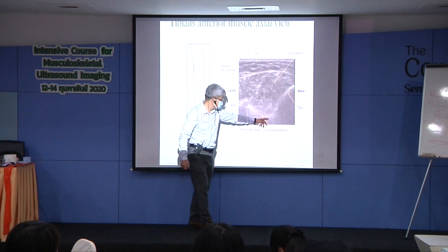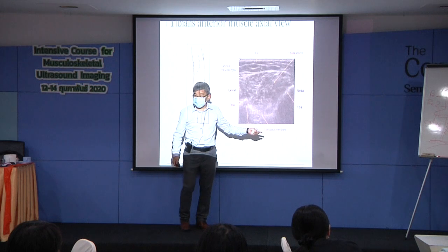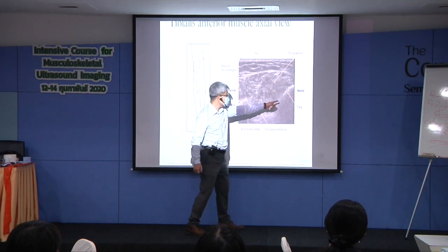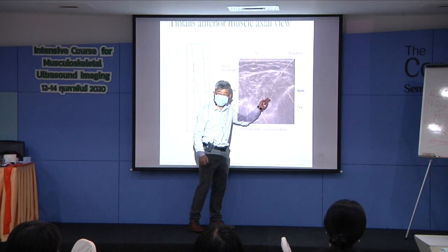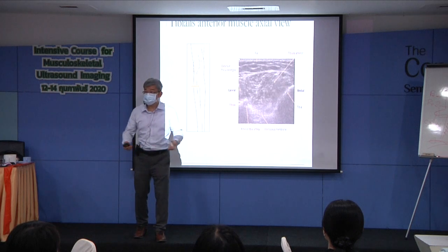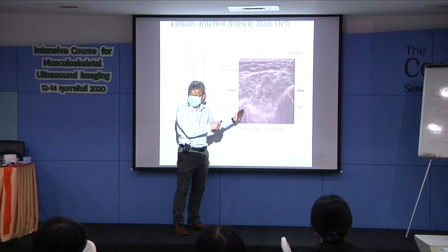Tibia, interosseous membrane, right? Cortical line is not clear. It's all right. It's a textbook of bad examples, and you can judge it. Okay, cortical line is not clear. Muscle cross-sectional area is not clear. I didn't see any starry night. This is rubbish. So the book is very cheap, so you can download it free. But you can look at something like this and know, okay, I can make my image better.